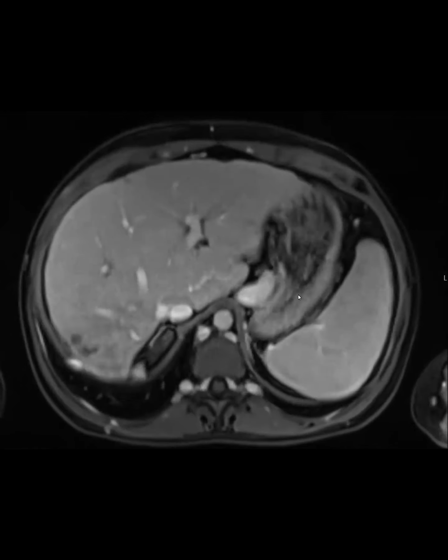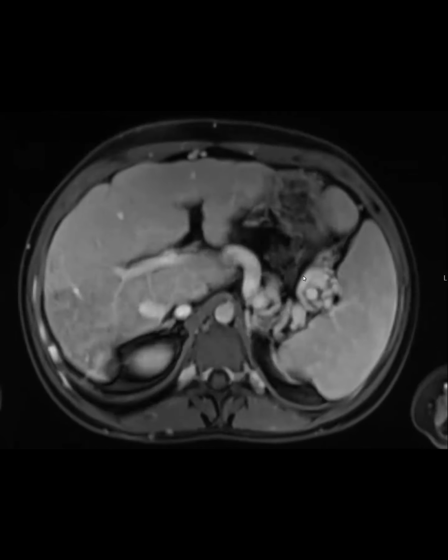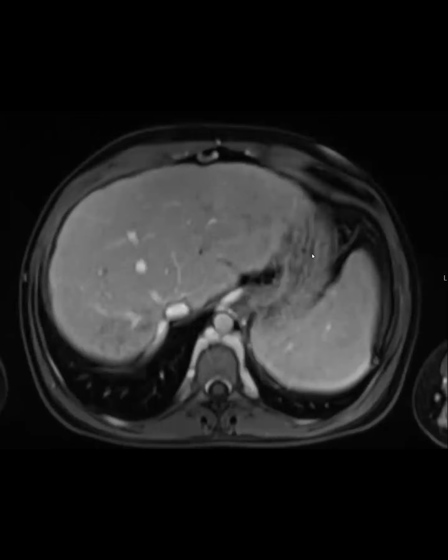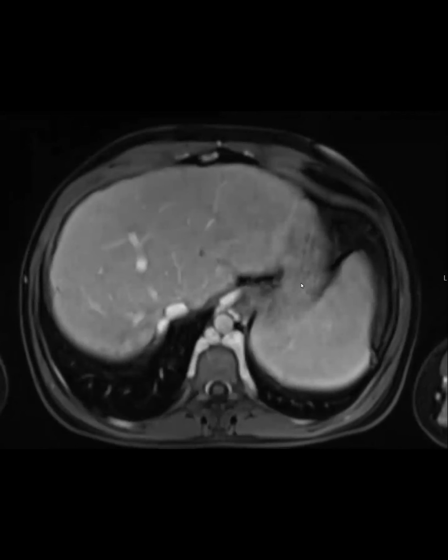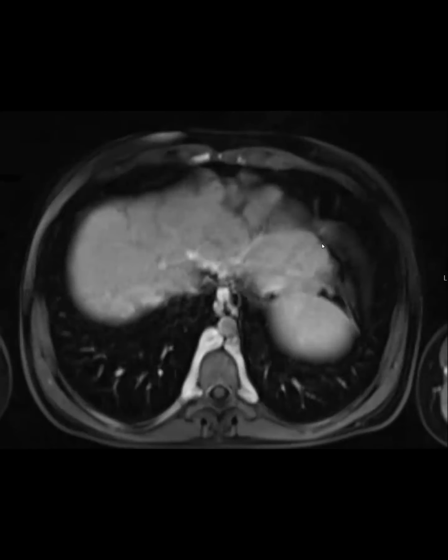Extrahepatic vessels though, like there's more varices than we ever see. Extra or intra? Okay, the type of varices you might see if there is an IVC occlusion or something, maybe a lot of shunting. Yeah, like where's the left hepatic vein? So just right, middle, left. I see the right. Where's the middle and the left?